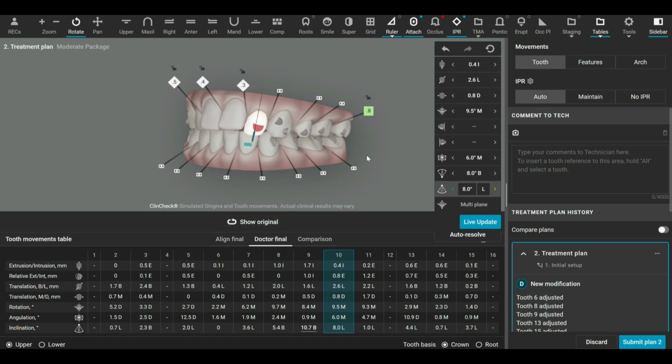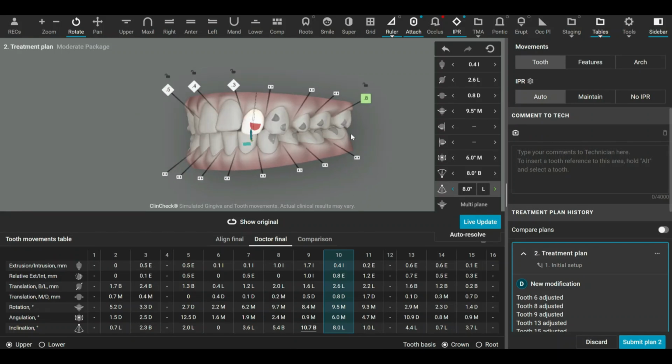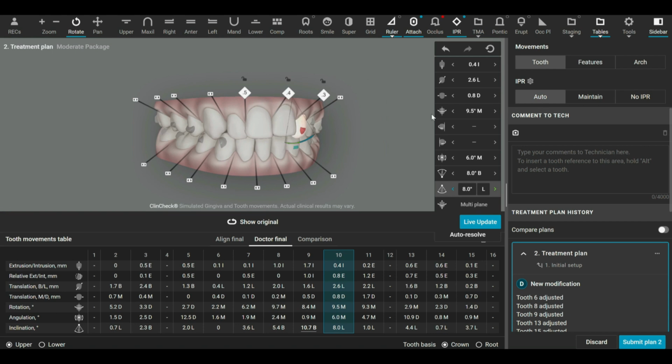And it's difficult for me to just look at all those and figure out what to do. I just go tooth by tooth and I check tooth movements in a treatment plan. It only takes 5 minutes or so to do that. And I look at the values on the control bar and I adjust those for predictability as needed, okay? So hopefully this is helpful for you. I highly recommend you learn that tooth bar, practice with it.